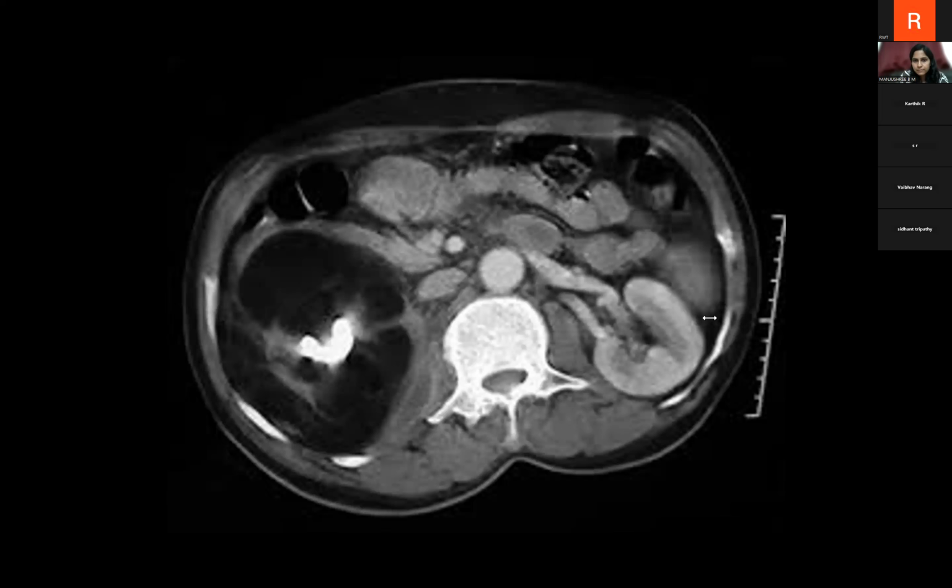Time is up. Okay. Renal replacement lipomatosis. Very good, very good. Purvita has answered it correctly. This is renal replacement lipomatosis, and also there's a calculus here. Why renal replacement lipomatosis? Here we are hardly seeing any parenchyma left. It's all replaced by the fatty tissue. So this is renal replacement lipomatosis, and there's a hyperdense content here, that is calculus, Staghorn calculus.